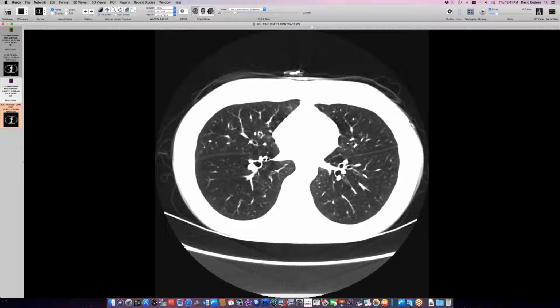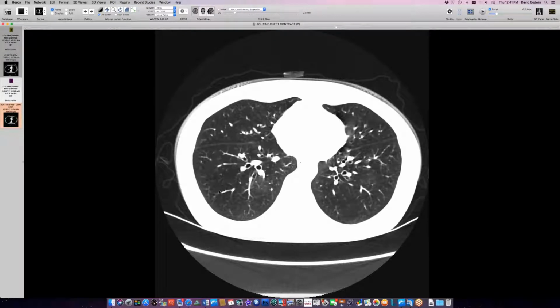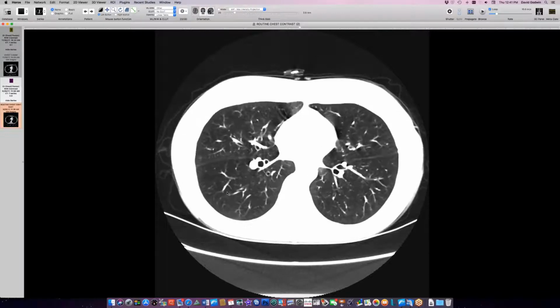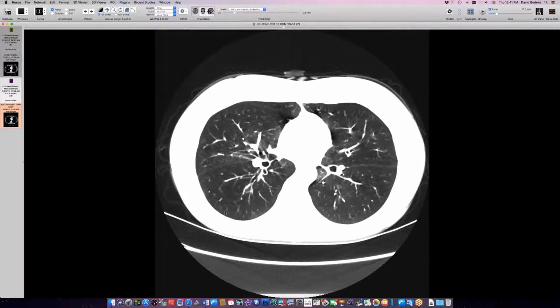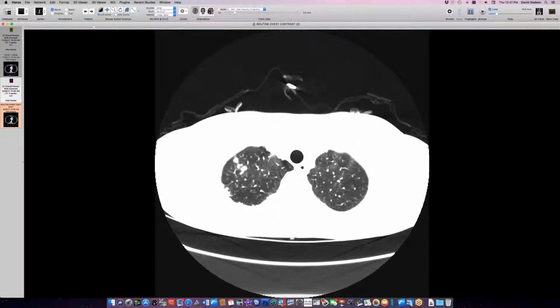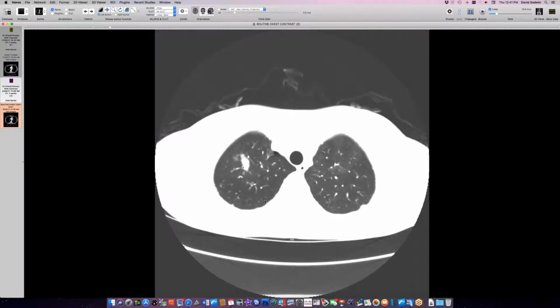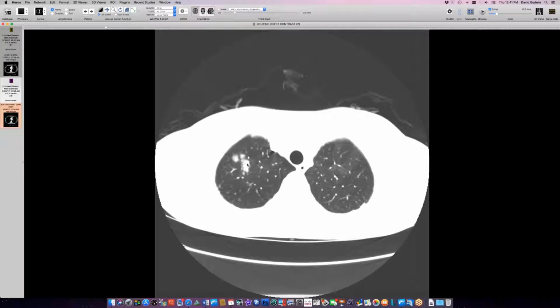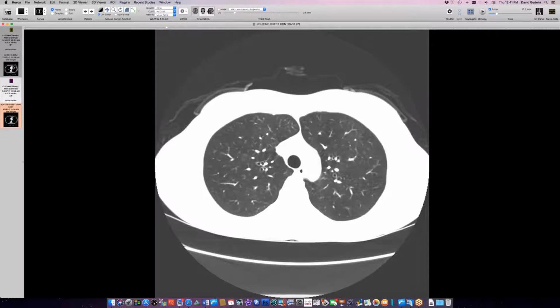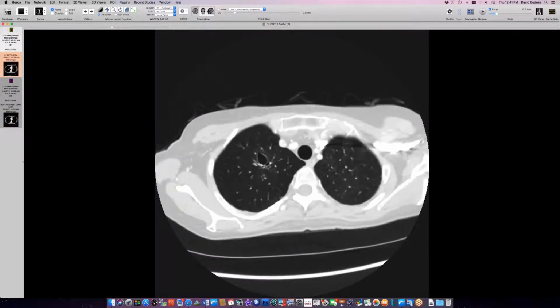I'm getting myself confused. I think this is a stem cell transplant, so I think this is graft versus host disease leading to obliterative bronchiolitis or constrictive bronchiolitis here, with accompanying bronchiectasis. The other thing of interest is these apical lung lesions looking a little bit like the TB case that Travis showed earlier. We have some lesions here that seem to be tracking airways. We have a later CT scan that now shows cavitation where we had that big nodule on the right.